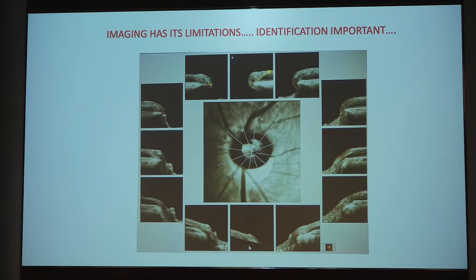Knowing that, you have to know that imaging has its own limitations and identification of which is important. Now if you see this image again, the due diligence that you are doing, you will see the image below here which has gone for a toss. So irrespective of how good your device is, optical devices have their own limitations, and you should be absolutely sure of what you are looking at.